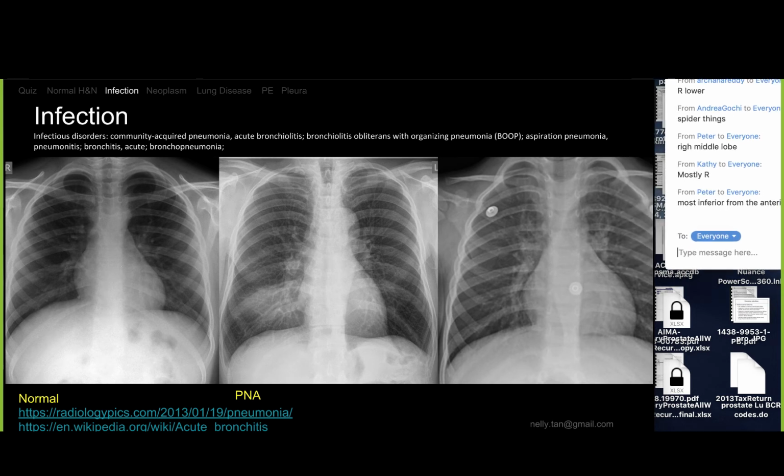What about here? Normal, abnormal, don't know. So we look at the airways and we look at the little bronchioles, right? So the heart is a little prominent. I think it could potentially be projectional. Bronchioles, you start to see the bronchioles a little bit more, right? Here, for example, in the retrocardiac, you see the bronchi, but here you really see the bronchi very well. It's outlined because it's thickened. The bronchial wall is markedly thickened on both sides, and you see this cuffing around the bronchiole.